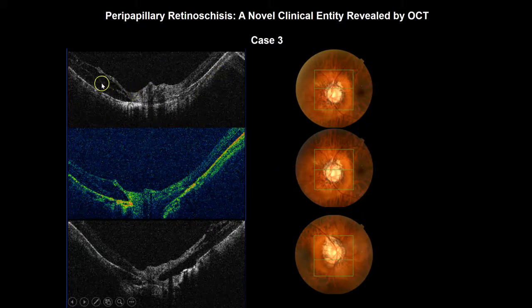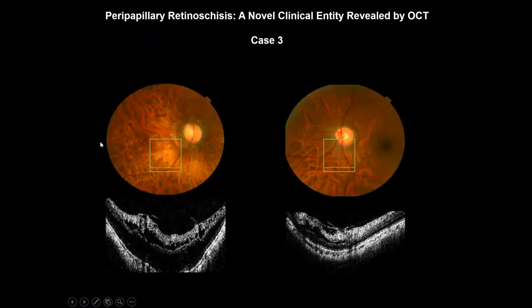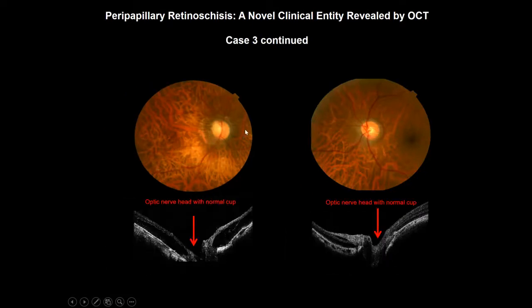One patient, we can see, again, the schisis, which shows up pretty well. This patient has schisis in most areas right around the optic nerve head. Here you can see the schisis, and this is a myope, about a 12 diopter myopia. So the schisis actually goes right into the macula, or right below the macula. Here's the fovea. And splits in the retina are not that unusual, but hard to see clinically.